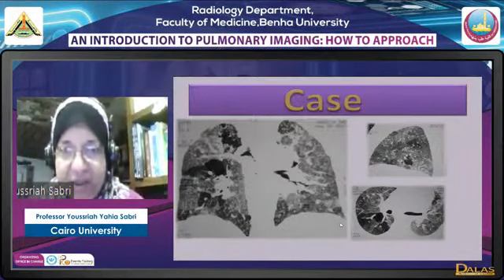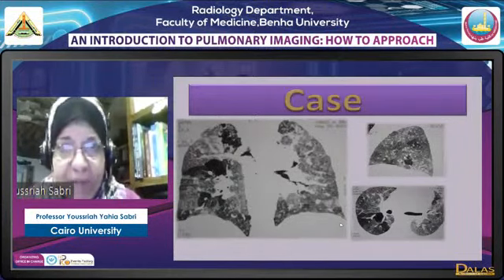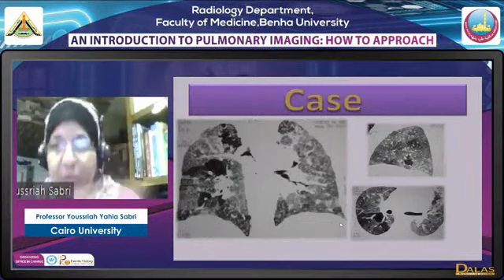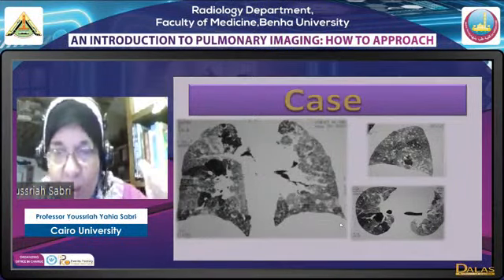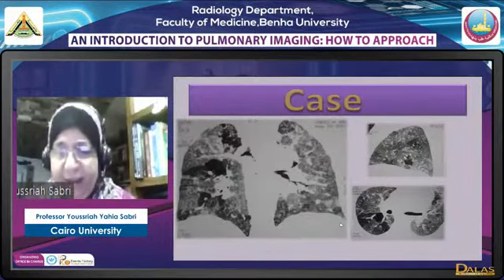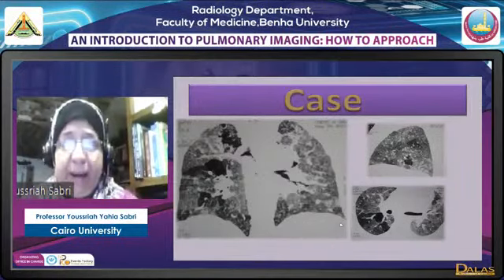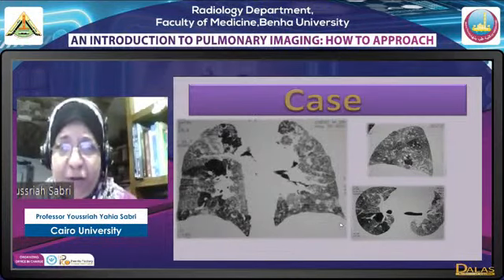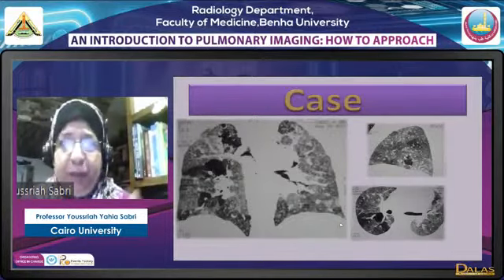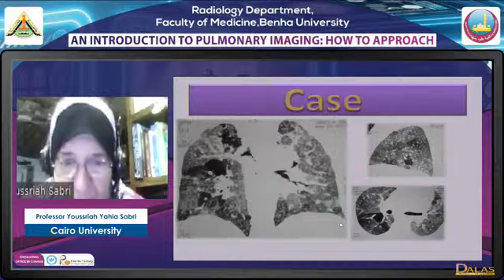But in high resolution CT, there is a pathognomonic appearance. This is the pathognomonic appearance of subacute hypersensitivity pneumonitis. What is subacute hypersensitivity pneumonitis? Well, it is considered an interstitial disease. It may be considered also as an organic pneumoconiosis. The patient inhales some infectious organism, certain organic dust and so on; patients raising birds, patients working with hay, farmers, all are subjected to such disease.